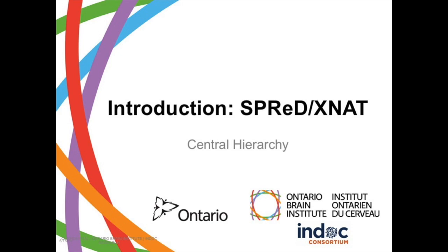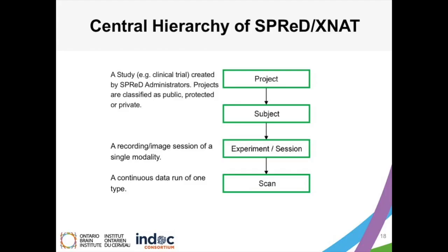Central hierarchy of the SPReD XNAT platform. The following diagram outlines the central hierarchy within SPReD from least to most granular. Projects represent a study, for instance a clinical trial, and can only be created by database administrators. This is to ensure that projects have approval and follow the naming conventions.